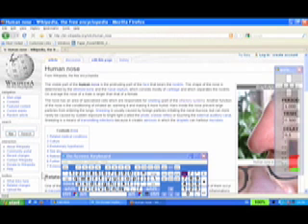Upward motion selected, stopped, and now the double click will be selected here in order to activate the Wikipedia search for the term nose. As you can tell, using this interface, the user can in fact activate or actuate the entire computer, surf the web, write email, etc.